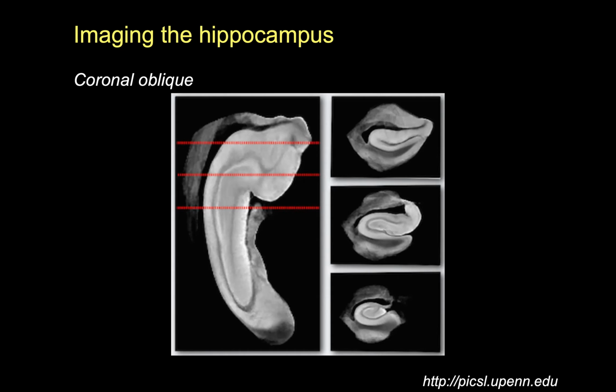Dr. Klein, just looking at that on a coronal view, is that the head or the tail? And how can you tell? So those digitations that I mentioned, this is a cross-section through the head of the hippocampus, this upper image here. So usually you can see these sort of digitations here, which tells you that you're close to the front.